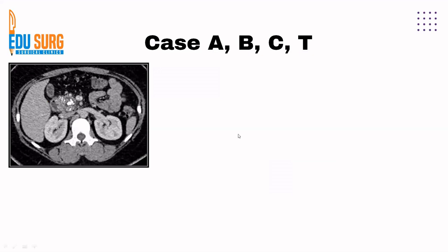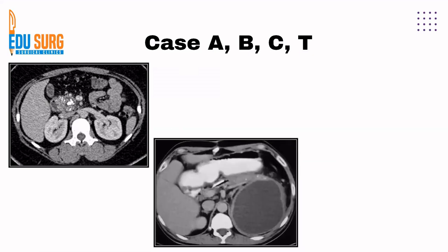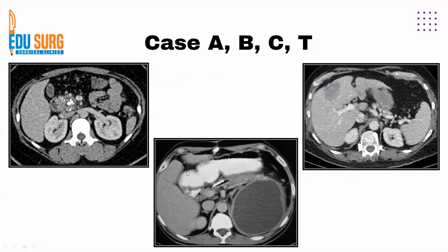Looking at some more cases, we saw air, we saw blood, some calcifications in the head of pancreas. Calcifications look white. You can see the bone is white on CT. So calcium is white. So, calcifications in the head of pancreas. Another case where you can see a white linear structure in the pancreas. This is a pancreatic stent. Again, white because the pancreatic stent is a solid structure.